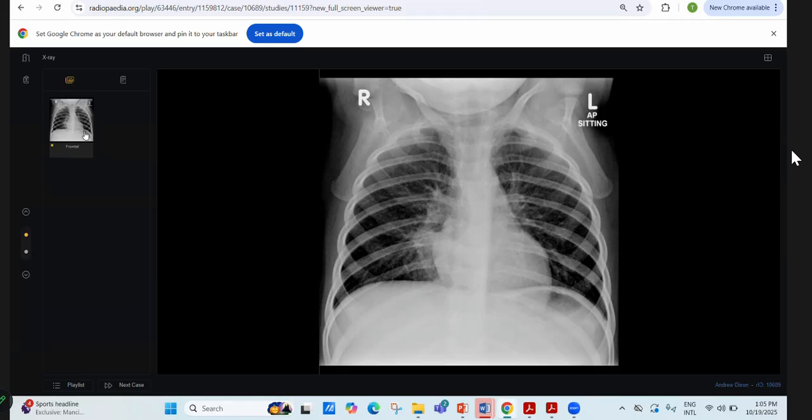This is an X-ray chest frontal projection, in which I can see that the right hilum appears to be bulky, and the left hilum is also prominent. Ma'am, can I do windowing as I cannot see a definite lesion within the lung parenchyma? Bilaterally large hila in this young patient. This could be due to possible differentials of this enlargement of the hila: lymphoma, tuberculosis, or sarcoidosis.